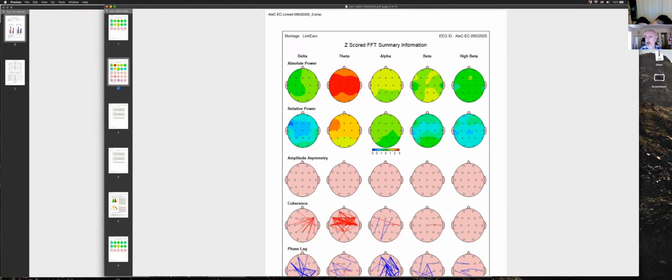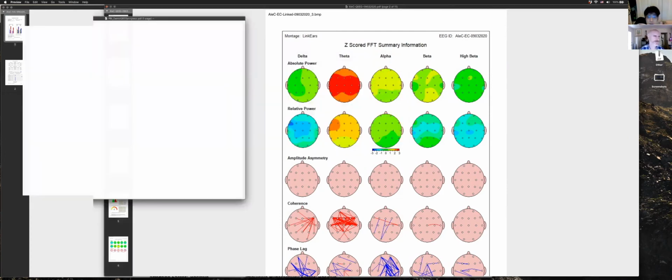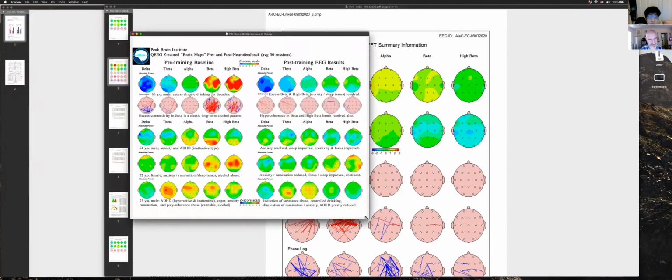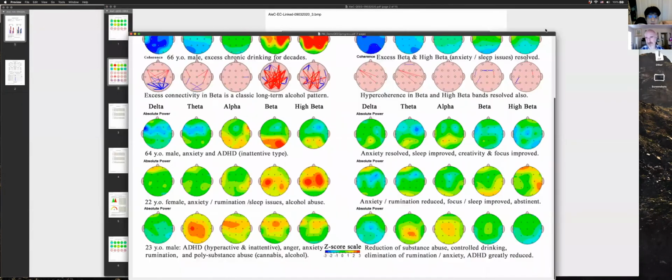Let me show you some other people for just a second. I have to run in a few minutes, but let me show you something. Okay, so these are four other people. Oh, holy shit. They're not you, obviously, but the interesting thing is, some of the same patterns.